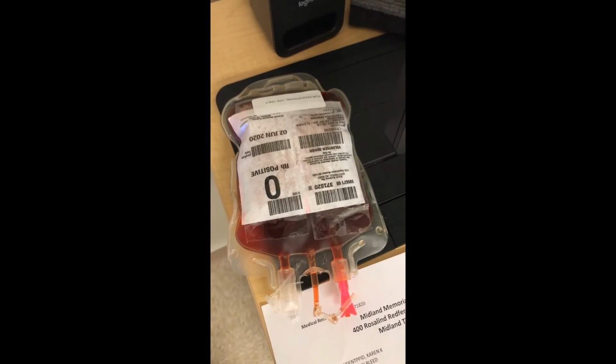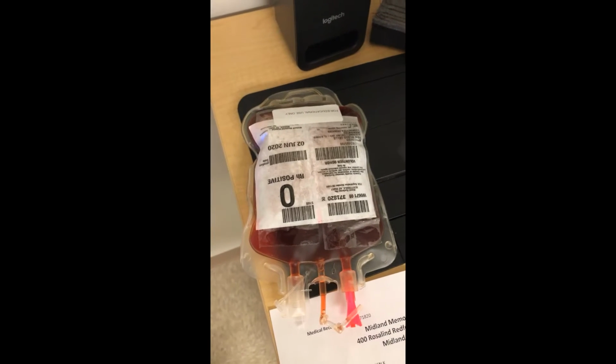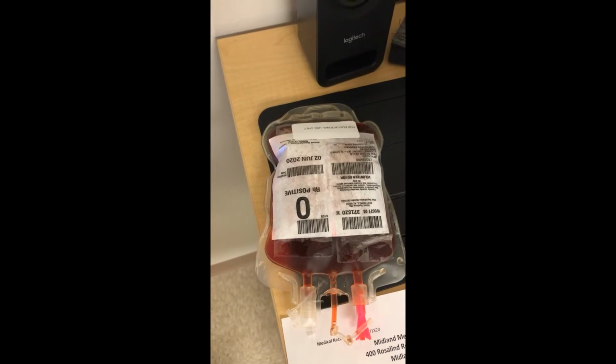Hey guys, we're going to talk about the blood administration process today. We're going to go over the process in Bridge.